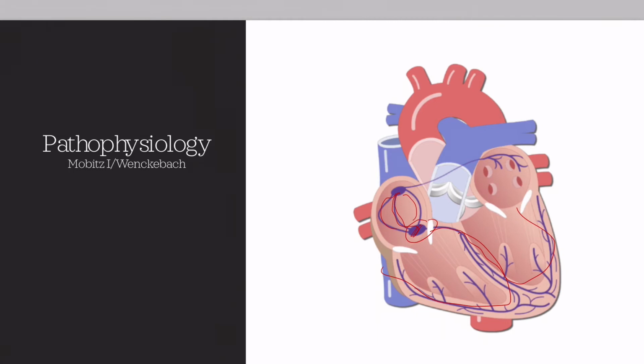This can be seen on the ECG that we did earlier, in which we have a P wave followed by no QRS complex. So moving on from there, Mobitz type 2, our block is actually occurring lower down in the bundle branches. So we're sending our signal down again until we hit our block. And the important thing to note between Mobitz 1 and Mobitz 2 is there's not actually a prolonging of our PR interval.